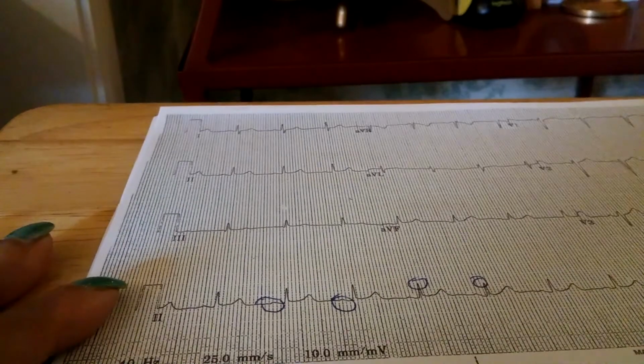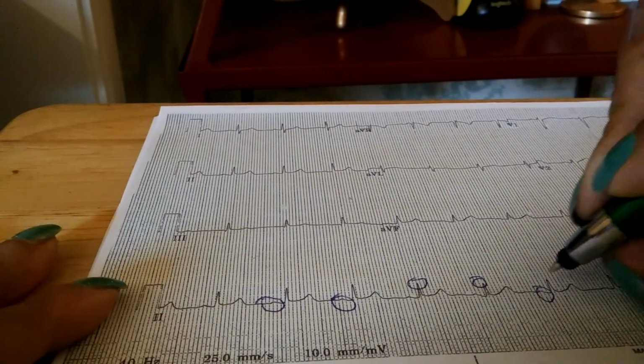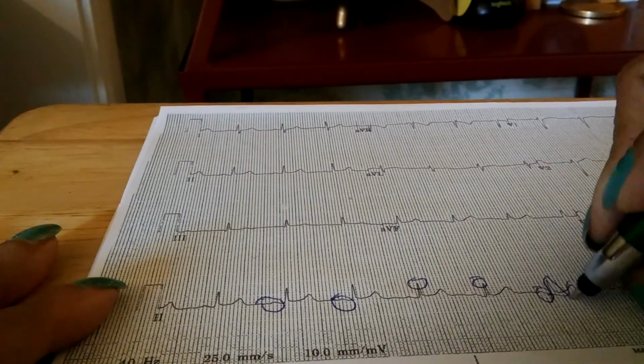Then you go back and see if there's a PQRST for every cycle.